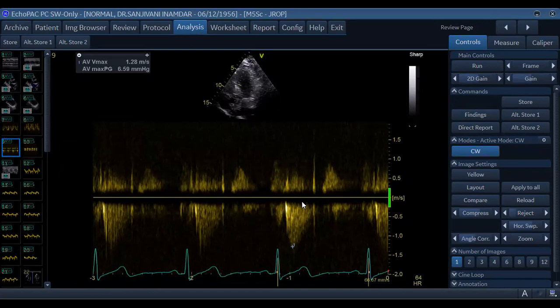So instead of saying slope, we say a longer acceleration time when we measure like this, at this point over here. So a longer slope means slower, and a shorter slope means shorter deceleration or acceleration time. This is a slope which is quick, so this is a shorter acceleration time. This slope is long, so this is a slower deceleration time.